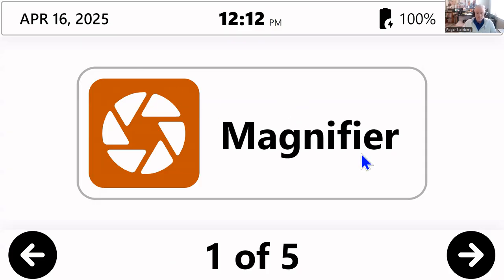Again, I'll provide a quick overview of the software and what it's about for those of you that have not seen it before. Across the top here, you'll see basic system information. So top left, date, April 16th. Center is the time, 12 p.m. here on the East Coast in the US. My battery status, and I am connected to Wi-Fi on the right there.